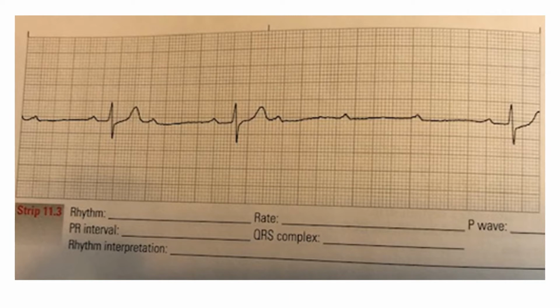So our rhythm interpretation, and as you reviewed in your AV blocks, it is a higher block. So between second degree type 1, second degree type 2, and third degree, the R to R is irregular. So therefore we can rule out third degree heart block. And the PR is constant. So therefore we know we can rule out second degree type 1. So this is a second degree type 2 with a 2-to-1 and a 4-to-1 AV conduction.